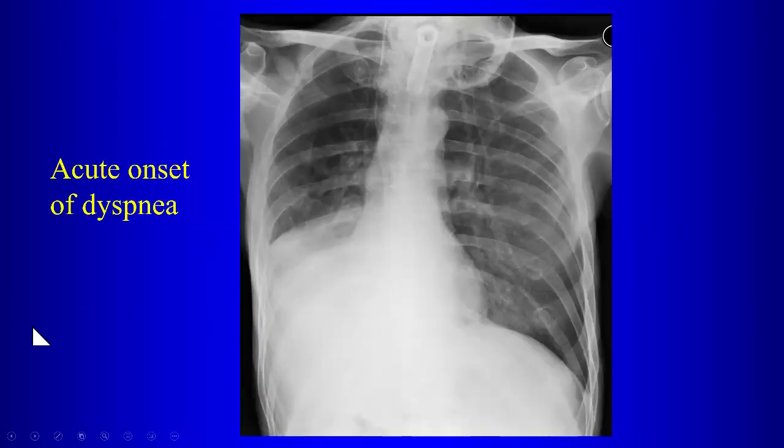So this patient, one of your ICU films, acute onset of shortness of breath. What's abnormal on the chest radiograph? So right middle and right lower, because we see the minor fissure, so I think there's atelectasis at the right middle, and also we lose the right heart border, so I think atelectasis of both the right middle and right lower. Okay, so what would do that? Yeah, so obstruction of the bronchus intermedius.